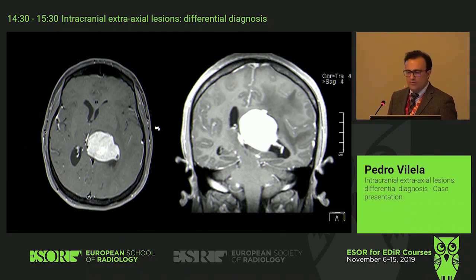Bright homogeneous contrast. And intense contrast. So if it was an intraventricular lesion, we would consider the possibility of a meningioma. Ependymoma? Yes, could be ependymoma, but very, very homogeneous. Don't have cysts associated, but it could be.